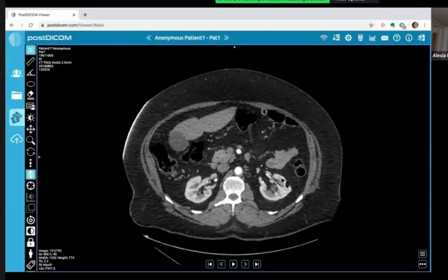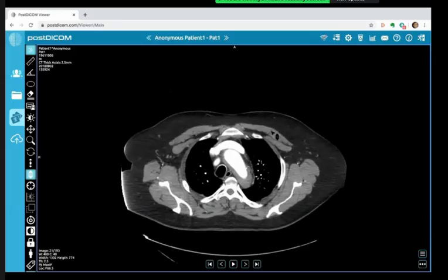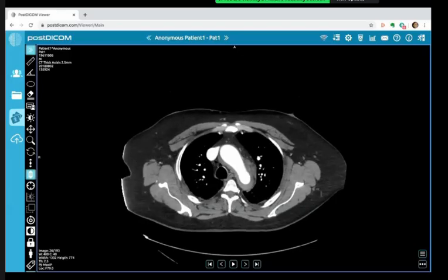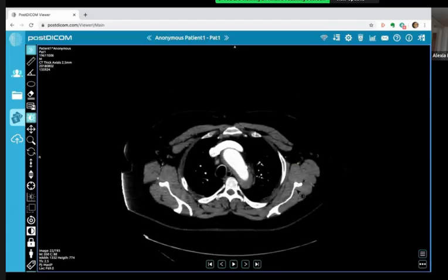For your diagnosis? Intramural hematoma, acute aortic syndrome, and the fat's a bit stranded, but I don't think it's ruptured there or there's any ruptured plaque. Oh. So you would window this, wouldn't you, to look for a flap, a dissection flap? Yeah. There was no dissection flap in this case.